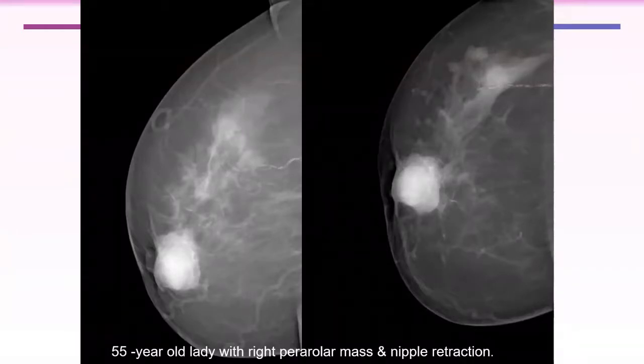This is a right breast CC view. It shows a retroareolar density or mass, a hyperdense mass with indistinct margin and microlobulations, and an inverted nipple.